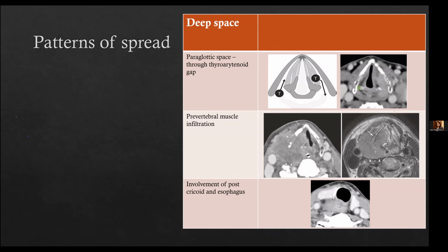So for only very focal lesions, it is very easy to identify, but for diffuse mucosal involvement, I would not say that diffusion is a very helpful imaging. For NI-RADS, I really don't know. I have to actually read about how much is the role of diffusion in NI-RADS.